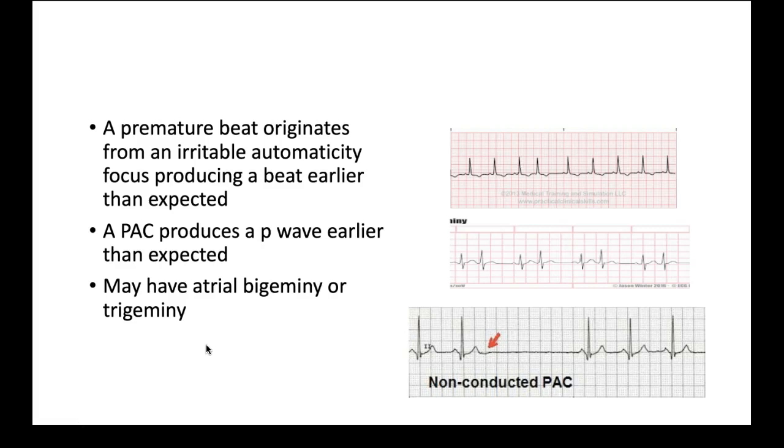But it's important to distinguish that this is different. If you look at the top EKG, it's different than atrial fibrillation. Even though when you first glance at it, you may say it's a little bit irregular because of that PAC, but you see there are P waves in front of every complex, okay? That's a clue that this is not atrial fibrillation. This is either a non-conducted or a premature beat.